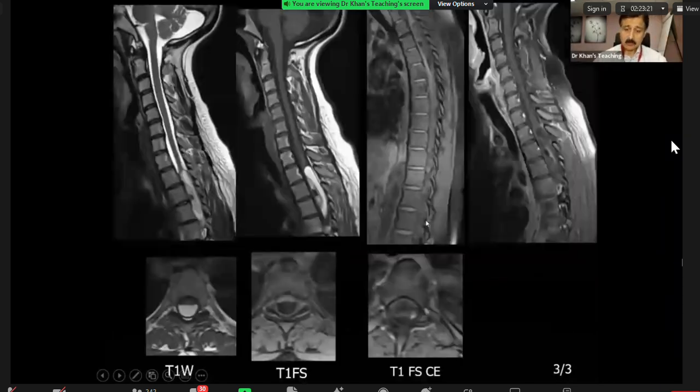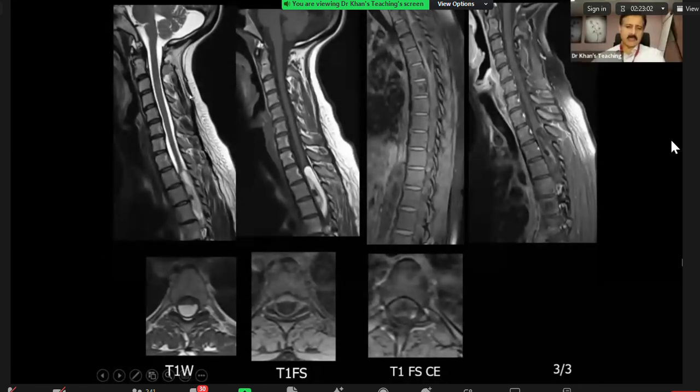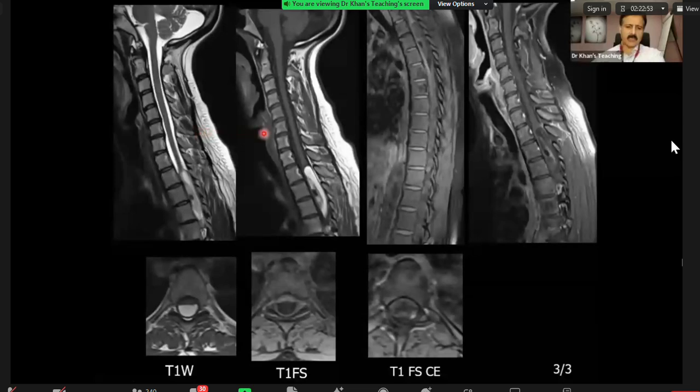This is the MR of the same case actually, and just as a practice, just describe it. So I've got a heterogeneous central cord lesion of mixed signal intensity. Name the sequence. What is this sequence? T2, followed by this T1. This one, T1.